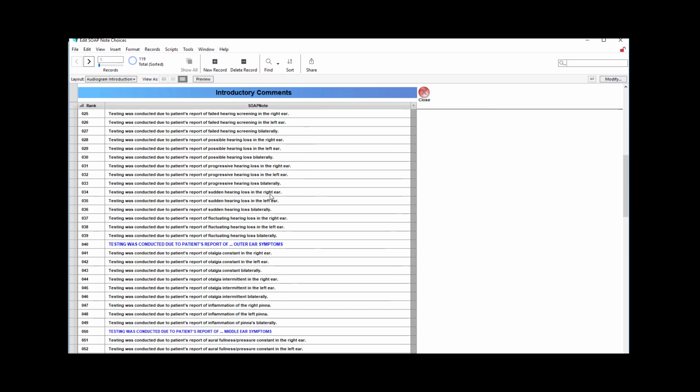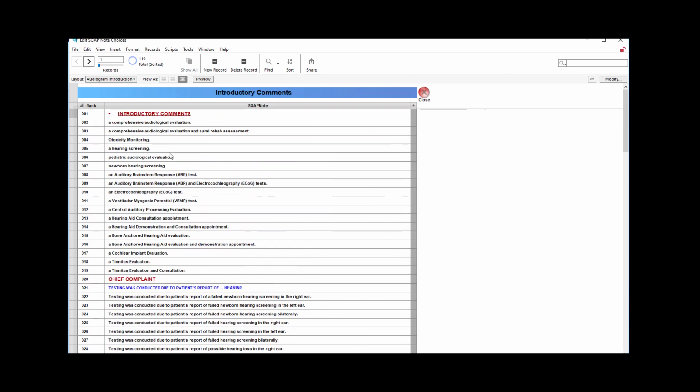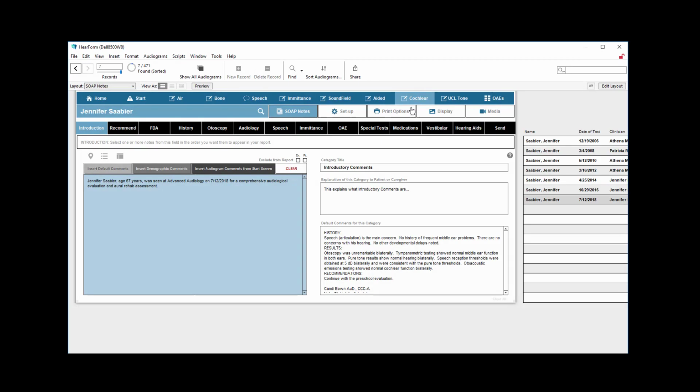But as you can see, you can scroll down and put these in a certain order, and they're all ranked off to the side here so that 1 through 100 or 1,000, however many you have, will be visible on here. Depending on your computer, if you have a whole lot of them, that may bog down an older computer, so just keep that in mind. I'm going to close that, and again, I can use the samples that are in here, or I can set up new ones, and that's done by clicking this button right there.